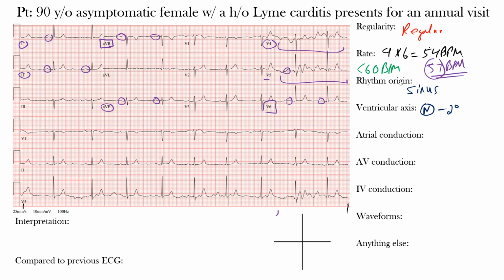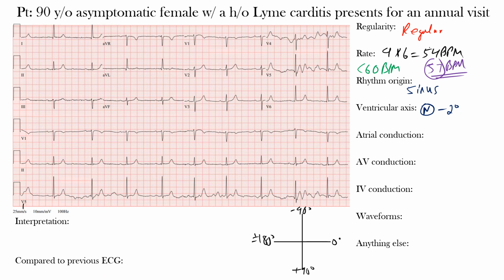All right, so the ventricular axis, some of the main leads we're going to look at are specifically leads 1 and AVF, and we can also look at lead 2 if we need to differentiate between it being a pathologic leftward shift or a physiologic leftward shift. Okay, so let's look at this now. Okay, so remember, this is where 0 degrees sits, positive 90 degrees, plus or minus 180 degrees. Okay, negative 90 degrees. Remember, we mentioned that lead 1 sits here, that's the positive end. Lead AVF at 90 degrees, that positive end. Okay, then we had lead 2 sitting about here at positive 60 degrees.